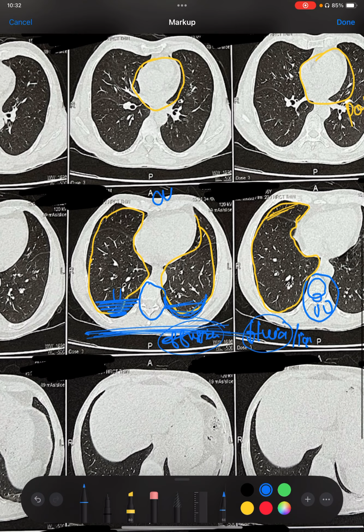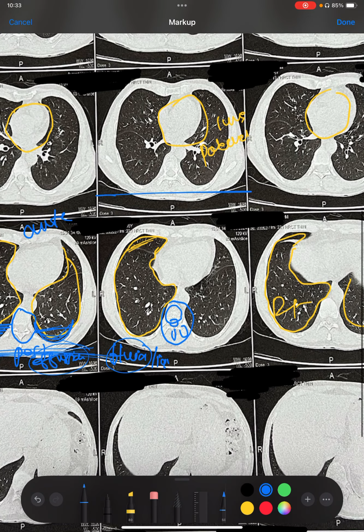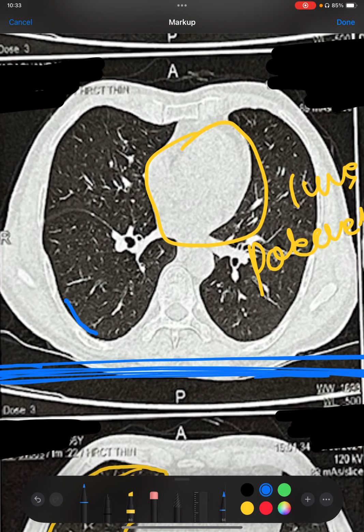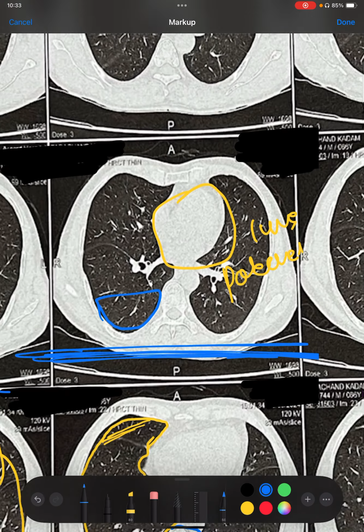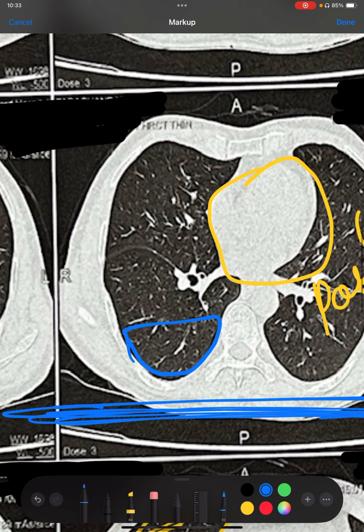This is an anterior area, this is the posterior or back portion of the body, and the patient is lying down in this CT scan machine like this. So we should be able to see if there is some effusion here. The same goes for pneumothorax, but in pneumothorax, it will be outside the lung parenchyma, and it will simply displace the lung towards inside.